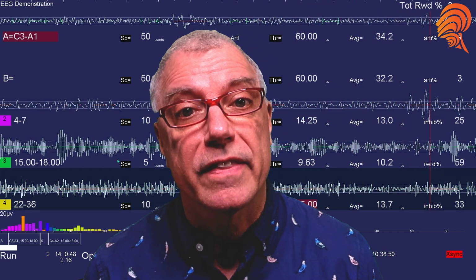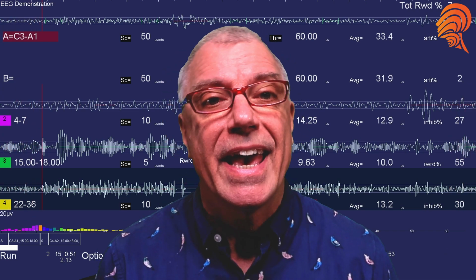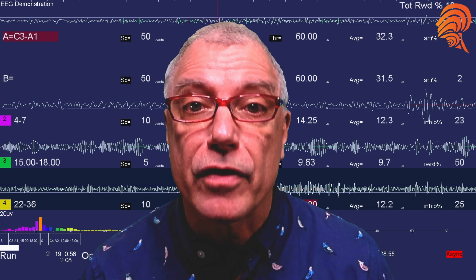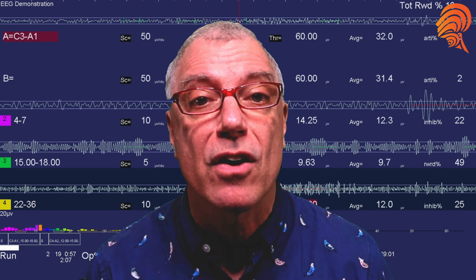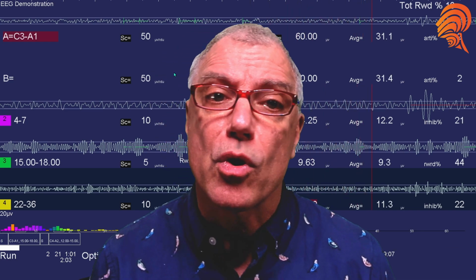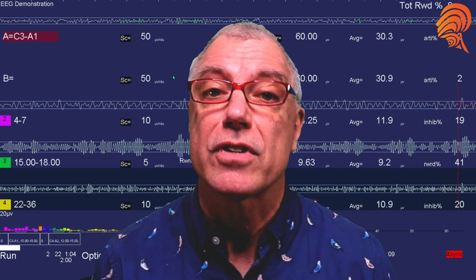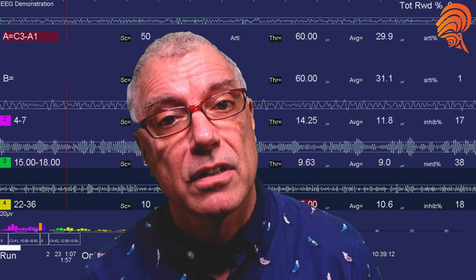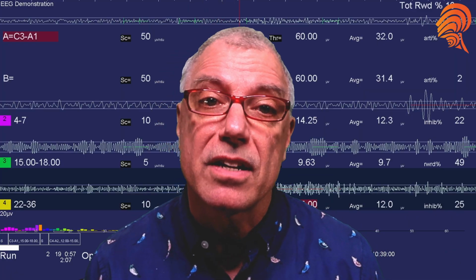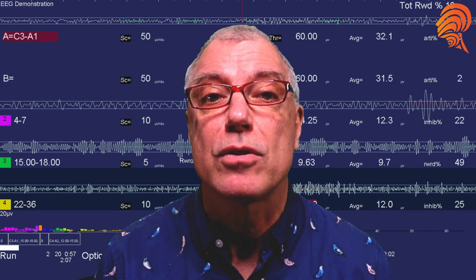You can pause and look at the data, make changes in the replay, and analyze specific sections that caught your attention. Then you can go back and do it all over again. Replay the session again to see how the recorded data responds to changes in the thresholds. Of course, you aren't actually changing the recorded data, but there are still things to identify and things to learn. What makes this feature invaluable is that you can spot patterns or events you might have missed during the live session. Maybe there was a sudden artifact, or perhaps your client had an exceptional training moment. Replay lets you study these closely so you can decide how to adjust the protocol.